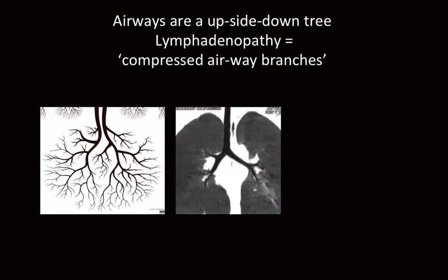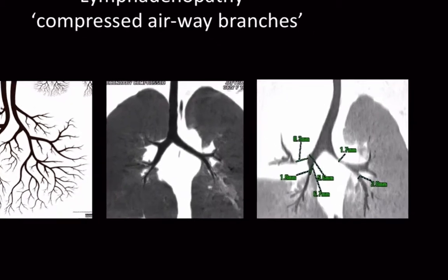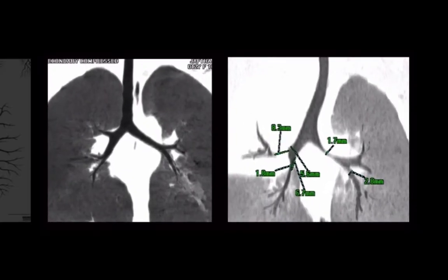So have a look. That's a CT scan of the normal airway. Smaller and smaller branches coming off the main branches. And this is TB in a child, again on CT with a coronal reconstruction. You can see the narrow areas of the bronchial tree. You don't have to remember any numbers. That's the beauty. Thinner branches are supposed to be more peripheral.